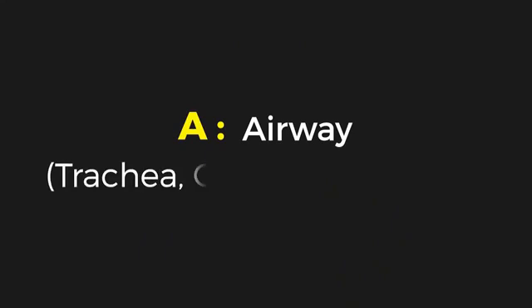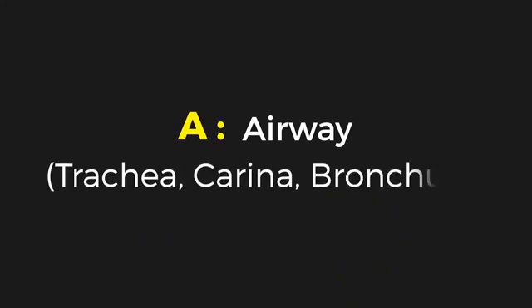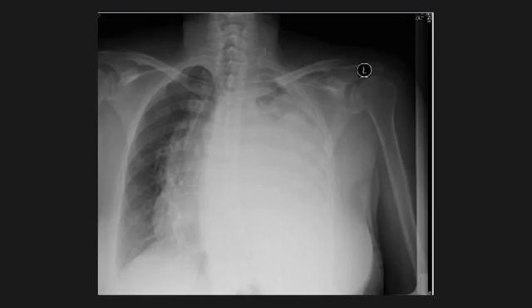In this video, I'm talking about a mnemonic so as to remember how to read an X-ray. Now starting with the A of ABCDE mnemonic. A stands for airway, that is the trachea, the carina and the bronchus. So look for any kind of tracheal deviation.